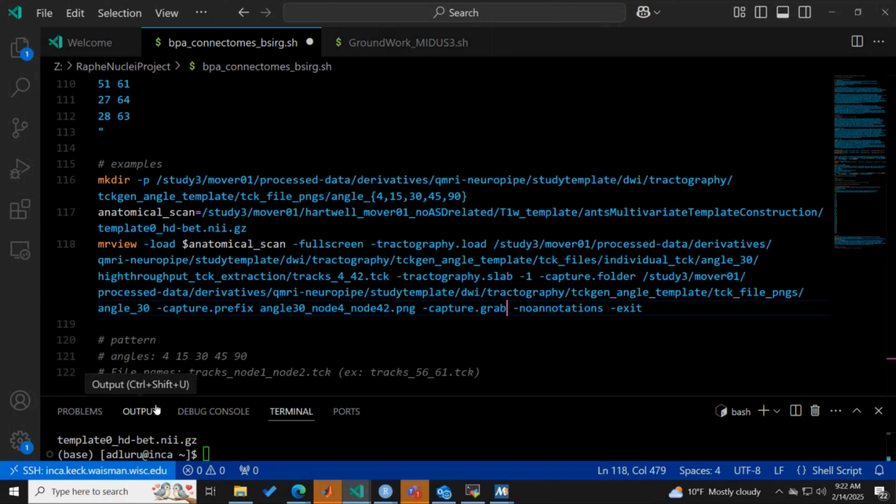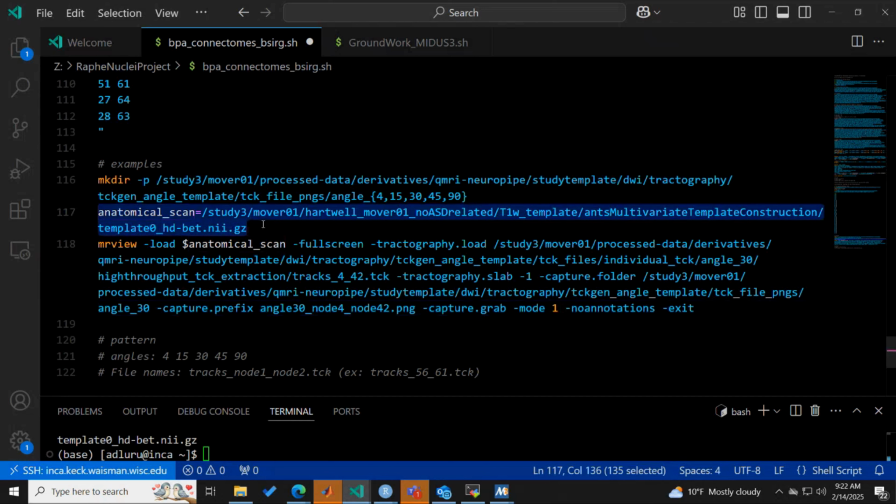One thing is, what was the mode? Can you just look up mrview mode, and what the ortho view is? It's literally 0. Okay, it starts from 0. Then if it's 0, single view is the first option, ortho view is the second. So would that be 1? Yeah. Okay, well, let's give it a shot. I think we'll find out.